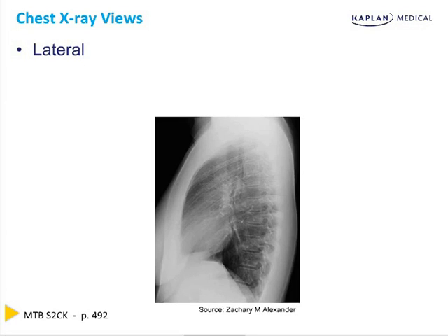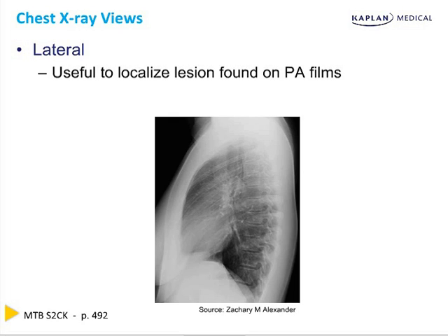Lateral X-rays, like the one seen here, are extremely useful in corroborating the findings seen on an AP or PA film. Having an orthogonal view allows for better determination of the front-to-back position of a lesion within the thoracic cavity, which can be very important in differentiating certain conditions, such as hilar lymphadenopathy secondary to sarcoidosis, from a mass lesion within the lung tissue itself.